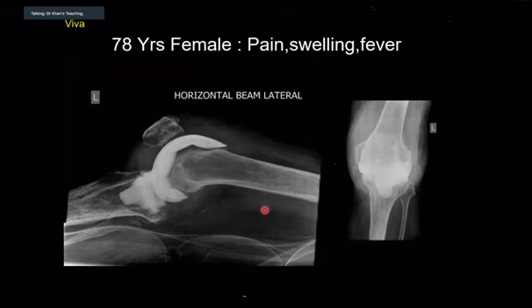What's happening there? I'm not convinced. When we're looking at a prosthesis, we look for periprosthetic loosening, so your thinking is absolutely right. Do you see anything there? There's a slight lucency in the distal femur where the prosthesis sits anteriorly, and then in the proximal tibia.